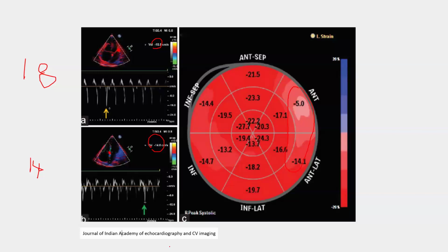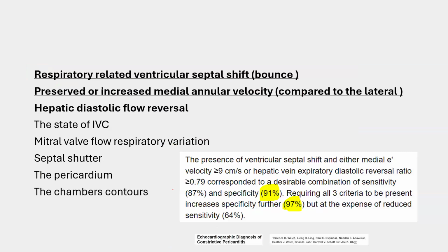Yes. Now I get you back, or I get you into the most important part, which is this: the echo signs of constriction.